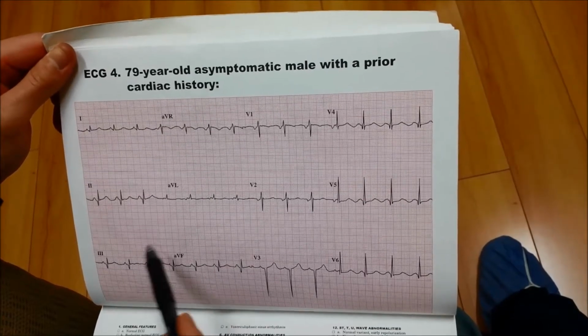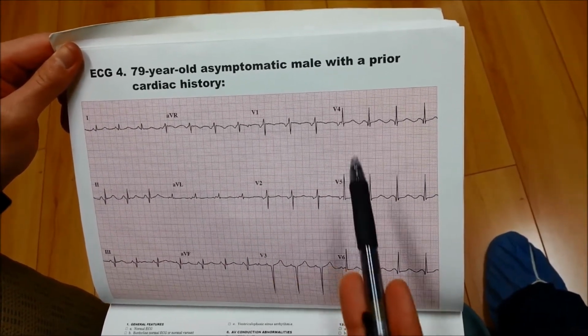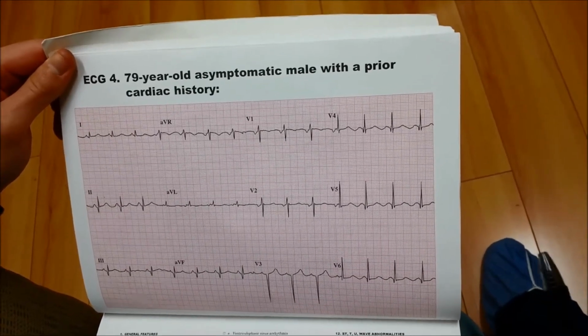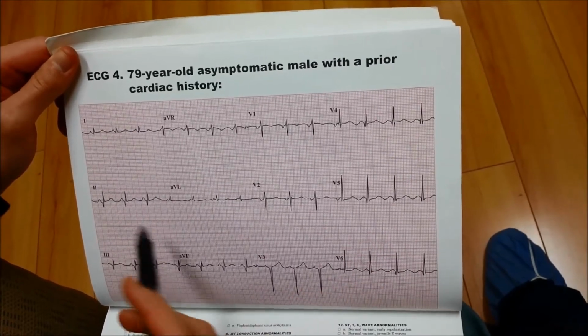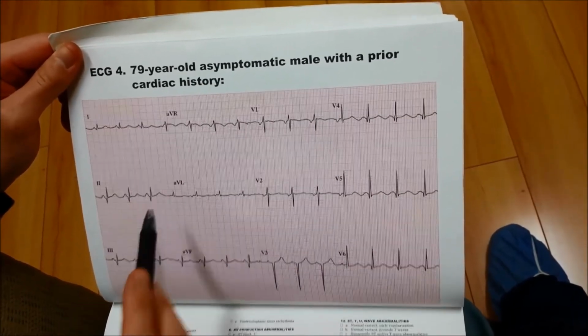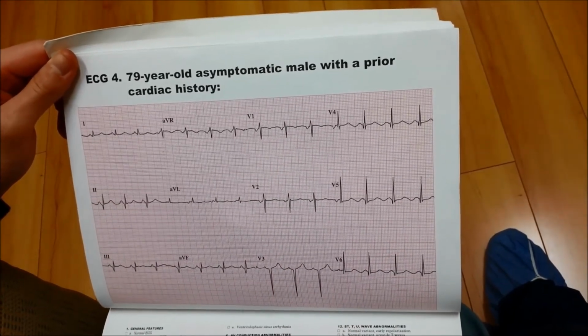So it looks like, I don't know whether these happened at the same time, whether they were different times, but basically this EKG, it's normal for this patient now, but he has had one MI that happened in multiple places. These are different arteries, that's why I'm saying multiple places, or 2 different MIs in his past history.